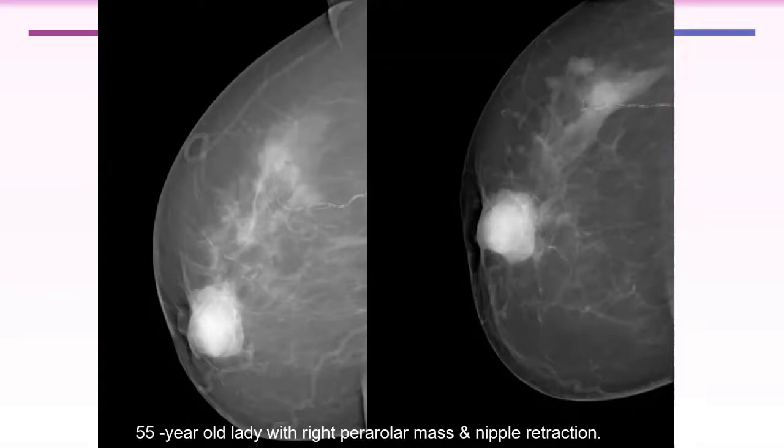Is it normal, or is there no other nodularity within this parenchyma? Yes, it is dense and nodular, and there are other multiple small equal density masses extending in a segment in the upper outer breast, extending down to the nipple. So I have a single retroareolar lesion and other multiple lesions.